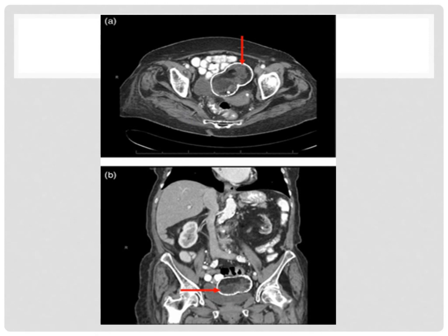Describe. There is a hypodense area. Okay, there is a lesion seen in the pelvis. Yes, mainly the left adnexal region. Yes. It contains wall calcification with mixed contents. You can see some soft tissue density, and this black thing is fat density. And a fat containing lesion in the pelvis is dermoid, maybe dermoid.